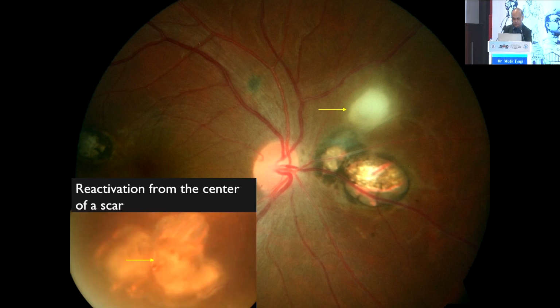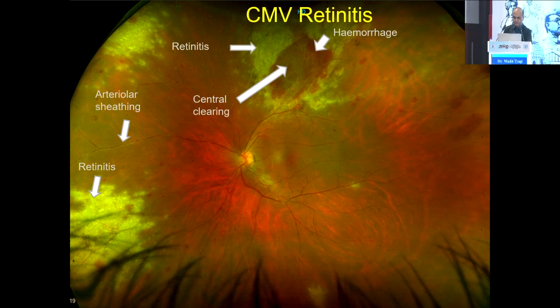One more important point to remember is the reactivation. So if you see a reactivation occurring from the center of a scar, that is a clue to tuberculosis. Whereas a reactivation occurring from the edge of a scar usually denotes a toxoplasma. So look at the pattern of reactivation.